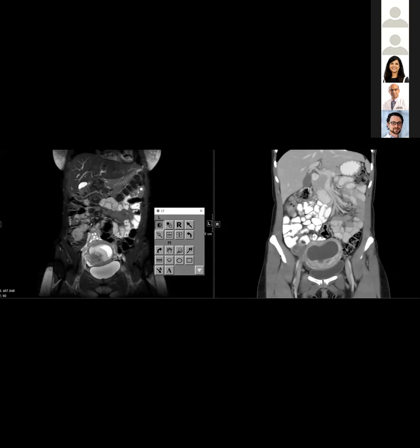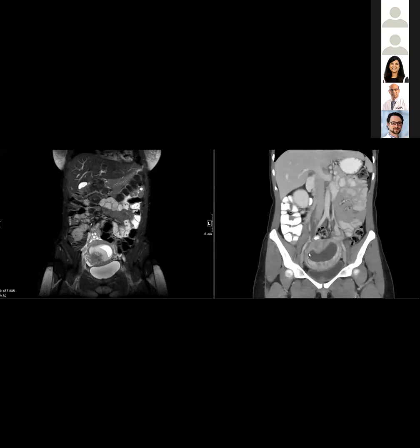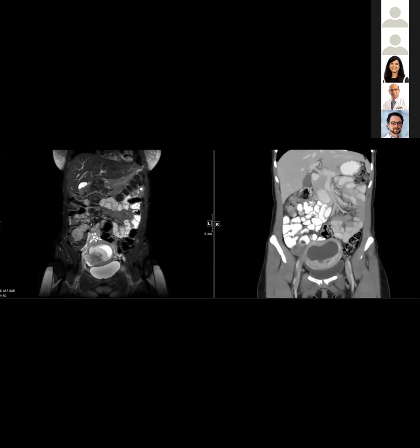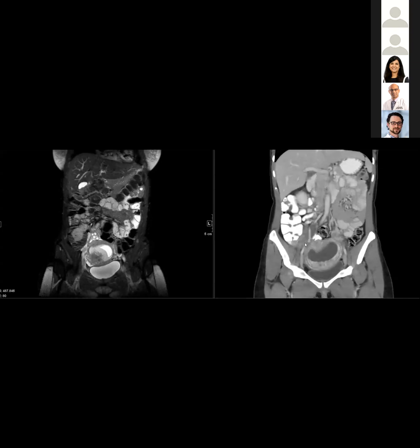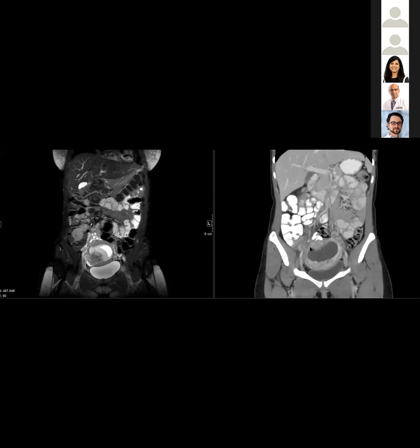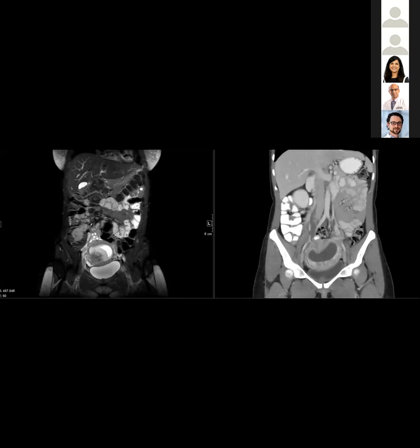She definitely has thrombosis of the gonadal vein, or partial thrombosis of the gonadal vein. But I suspect she also has some sort of either partial torsion or torsion-detorsion situation, and that may be the reason why this part of the vein is thrombosed. I don't have proof for that. They just put her on Lovenox, I think, and let her go.